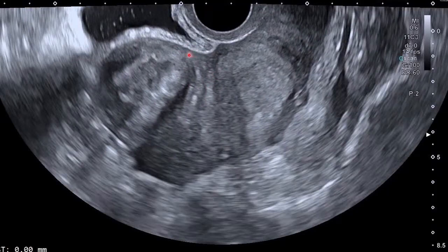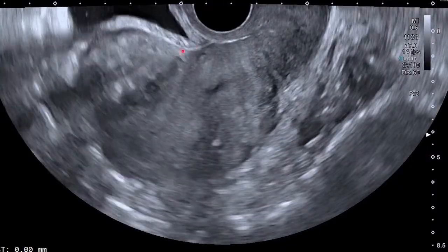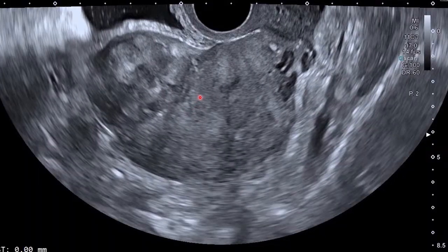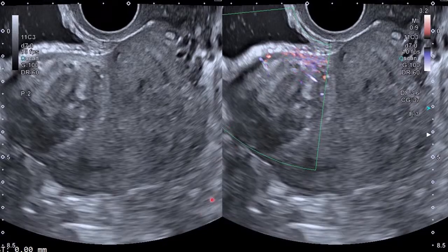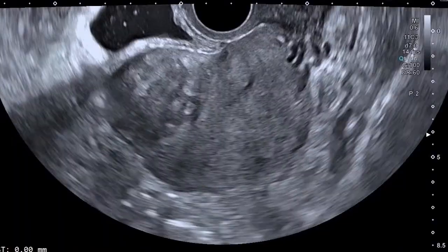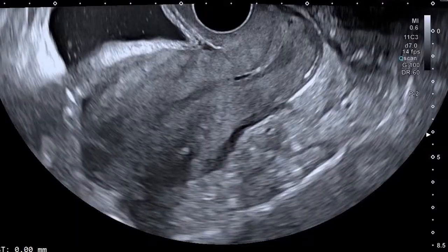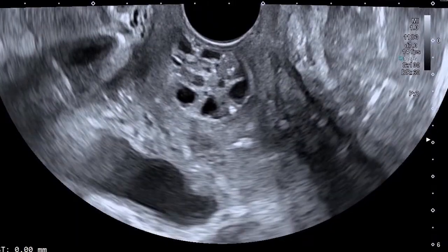So I hope you are also giving your differentials. If you think otherwise, I need you please to send your thoughts in the comment section to say that I think this is what this thing could be. What do you think that is?